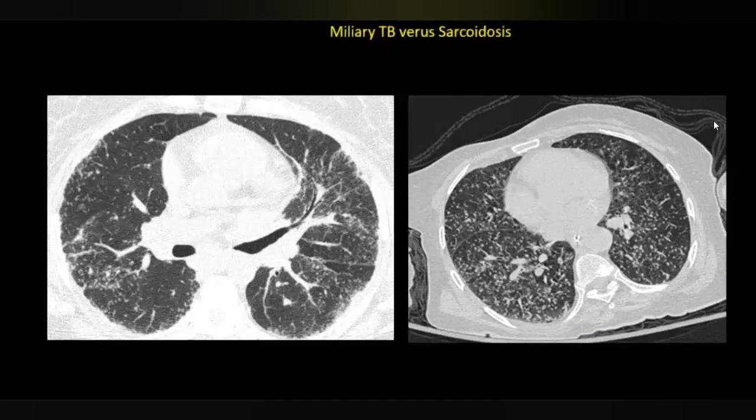Yes, sir. But there are nodules here attached to the pleural surface. So how come you are saying it's sparing of the surface? So there is no sparing. There is involvement of the pleural surface. Okay? Okay, sir.